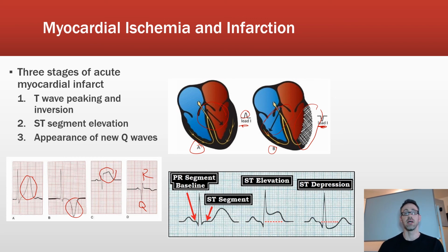So for us clinically, as I suggested before, anytime you see leads with Q waves, it tells you approximately anatomically what part of the heart has the dead tissue. So again, if it were lead 1, that would probably also be affecting lead AVL or V5 and V6. So those would be the contiguous leads, and they would show Q waves. And that would suggest the left lateral wall of the left ventricle. Whereas if it were 2, 3, and AVF, that might suggest more of the diaphragmatic surface of the left ventricle, or even the right ventricle. So that would be how we assess myocardial infarction.